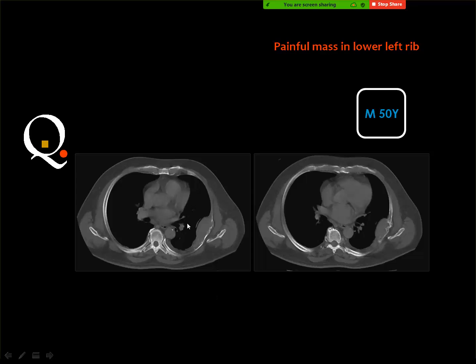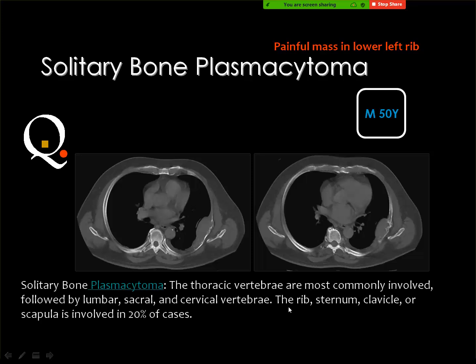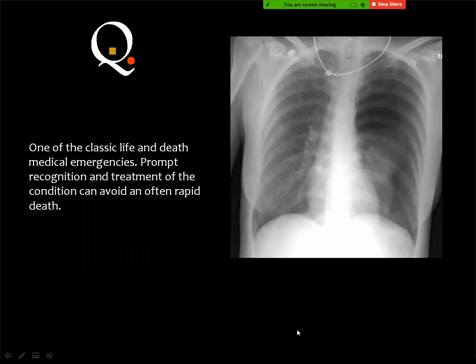Then the primary lesion in this location with some expansion is myeloma. Then you follow it by lymphoma, and finally you get a metastatic disease, and this has been proved to be a plasmacytoma. Okay.